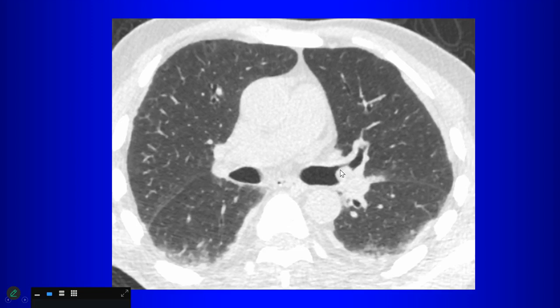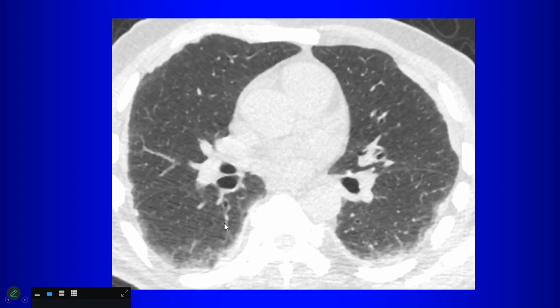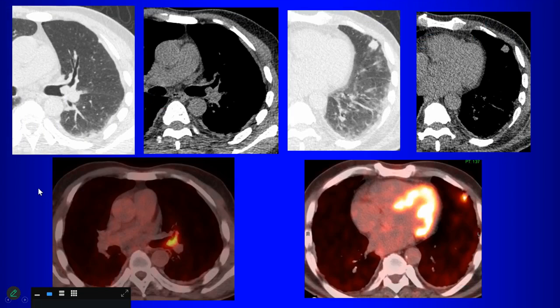As we go down, there's a big honker in there, right? There's a big tumor in the bronchus there. So this patient has more than one site of cancer. There's cancer in the left upper lobe bronchus there, and also there peripherally in the lingula. It's important when you're looking at CTs to add the airways to your checklist.